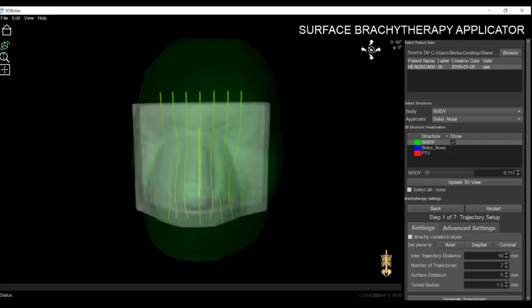When the user has a perspective of where they stand in terms of the whole workflow, it's much easier to navigate through the whole module and all the features that it has built in, and we'll see there are quite a few features built in. Having these steps clearly shown here, I think, very much aids the overall feeling of user friendliness and workflow within this app.